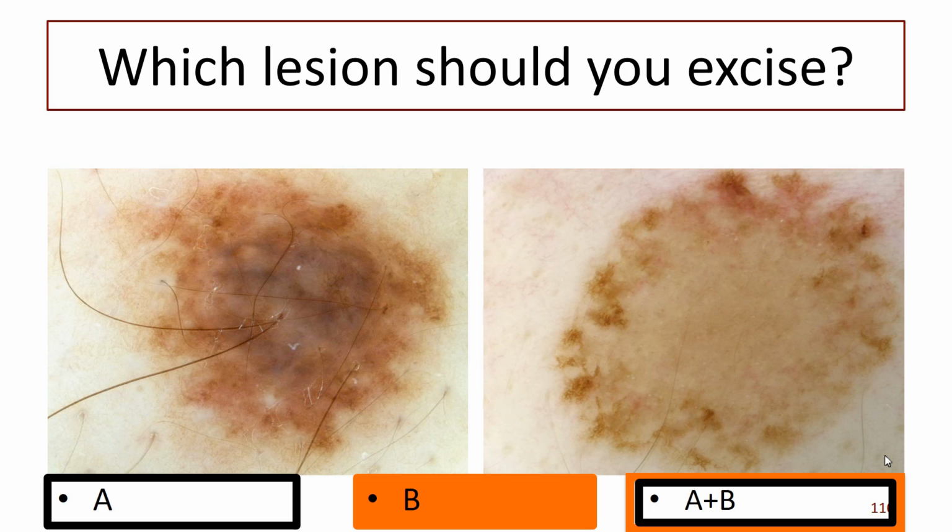So it's fairly symmetrical. This one has more structure in the middle, and we've got the funny blue colour coming in. Do you see these thick lines here? What are they? Hairs. Right. Does that help you at all?